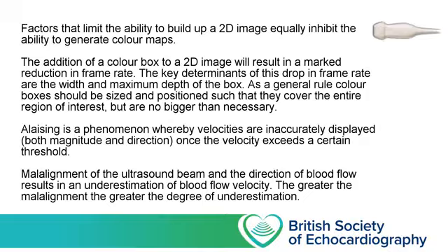Secondly, one of the most obvious drawbacks of using a colour box is the impact it has on your frame rate, and it will typically cause your frame rate to drop by about 2/3. The larger your box, the more of an impact this will have, and so whenever you are using colour you should have a think about the size and position of the box. Does it need to be as big as it is? As a general rule of thumb, you do need to cover the entire area that you're interested in, but your box should be no bigger than that.